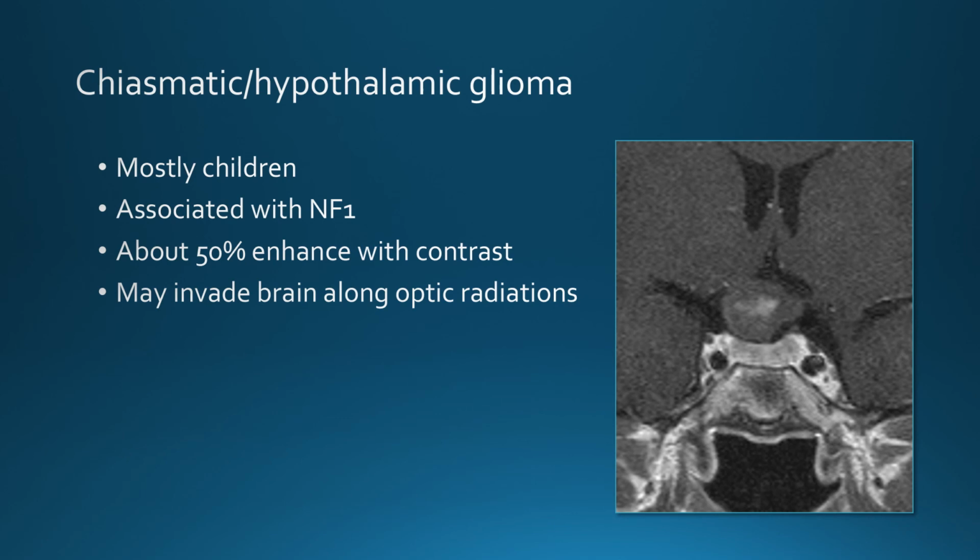So chiasmatic or hypothalamic glioma. Children, young adults, it's often associated with NF1. About half of them enhance with contrast, and occasionally these can extend into the brain along the optic radiations.